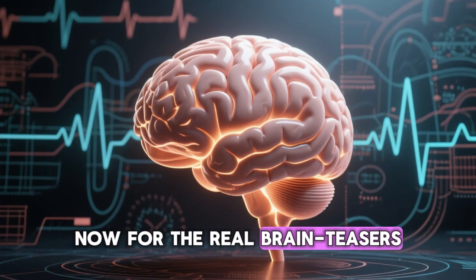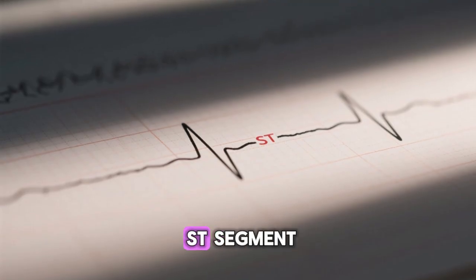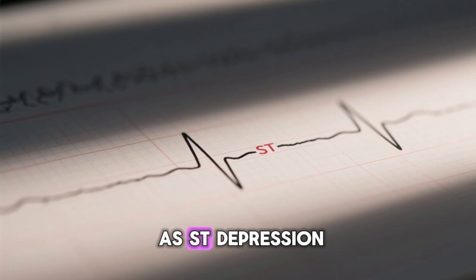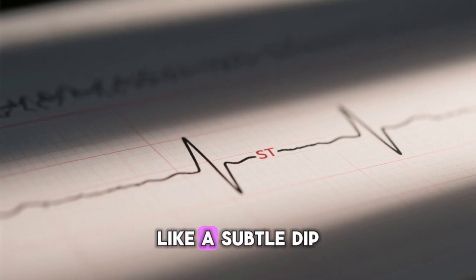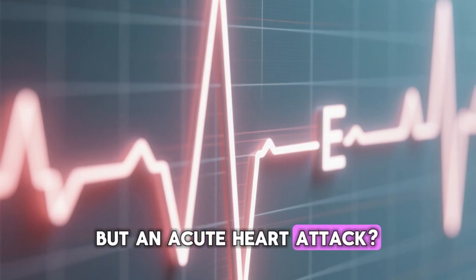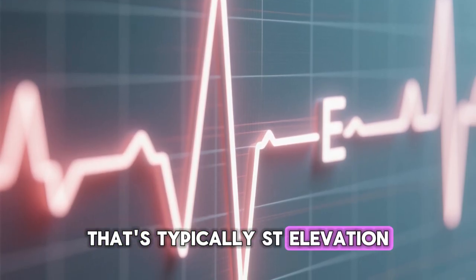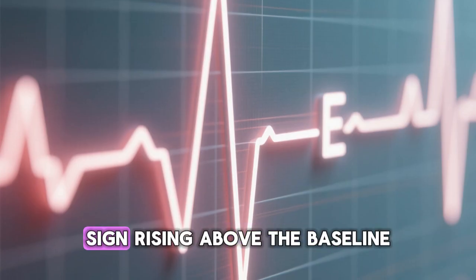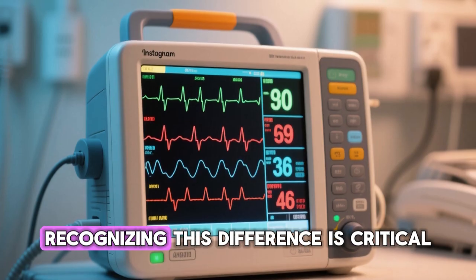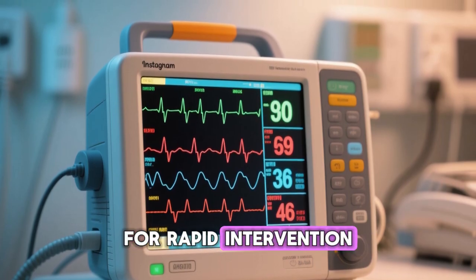Now, for the real brain teaser in interpretation, let's focus on the ST segment. Ischemia often shows up as ST depression, like a subtle dip below the baseline. But an acute heart attack, that's typically ST elevation, a clear tombstone sign rising above the baseline. Recognizing this difference is critical for rapid intervention.